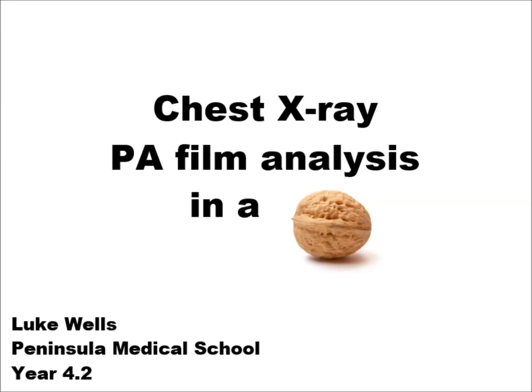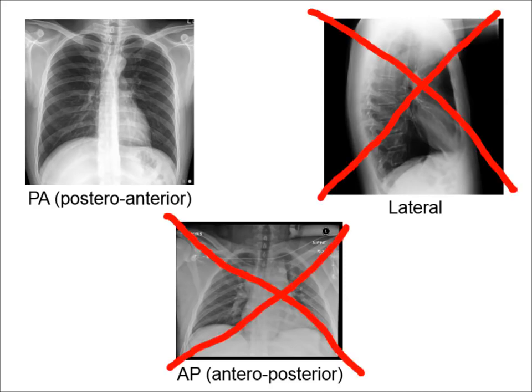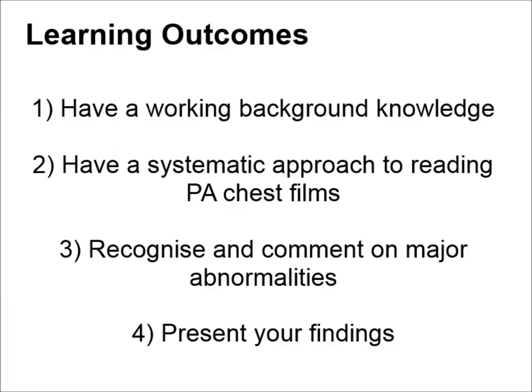Hi, it's Luke here, and in this video I'm going to teach you, in a nutshell, how to read a PA chest radiograph. Reading a chest X-ray is a vital skill for medical students and doctors, and often comes up in exams. While there are other chest film views, PA is the most useful and by far the most common view you will encounter, so this is what I'll be teaching in this short video.